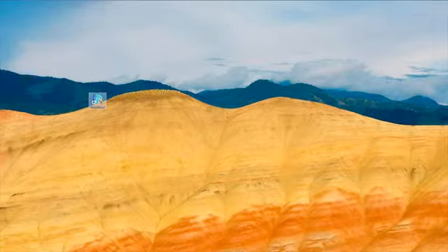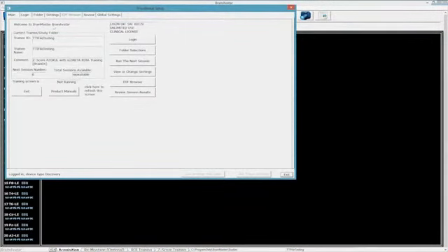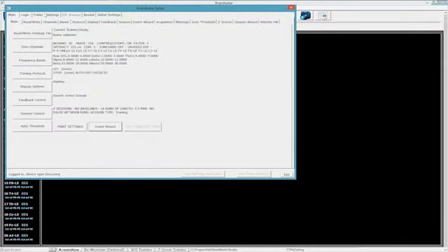But now that we got into it, let's go into the full details of what's new in the BrainAvatar Event Wizard. Now, there are some new functions that we wrote. And before I really start getting into it, what is the Event Wizard? Well, the Event Wizard is basically a way that we thought we can do more in the software than we initially thought.